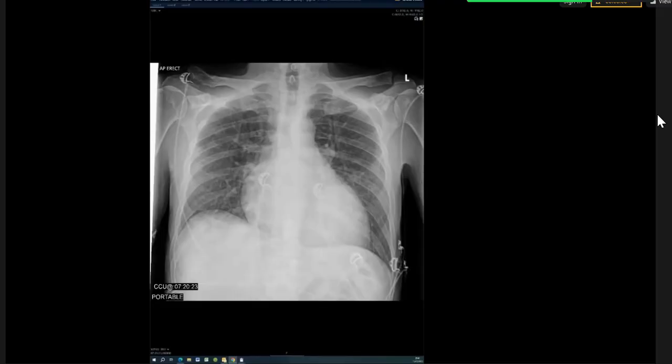You need to see reduced lung volumes to go down the ILD route. If you have general haziness, you need to talk about pneumonia, or if in doubt, pneumonitis is a good word, because pneumonitis doesn't really commit to an infection or idiopathic process, and in the beginning, ILD, like drug-induced, can look like pneumonia. So pneumonitis is a good word to get out of that situation. But differentiating ILD from pneumonia is a long conversation that we can pick up another time.